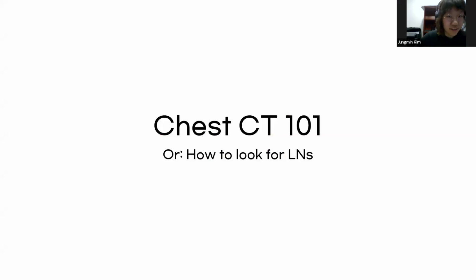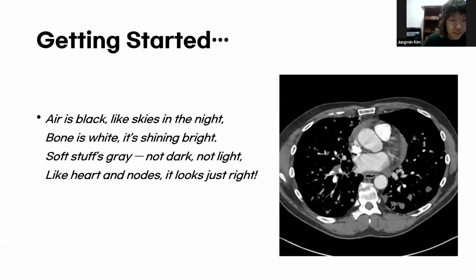Okay. So, hi everyone, welcome to Chest CT. Today we will learn how to read chest CTs with confidence, especially when it comes to spotting lymph nodes, which play a key role in cancer staging and diagnosis. The intended audience for this is medical students. So, for the medical doctors, this may seem a little bit basic, and sorry for that in advance.